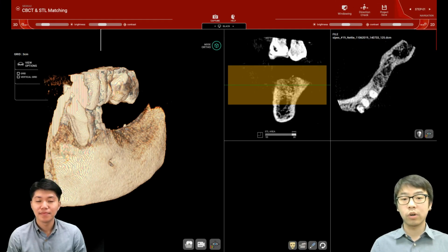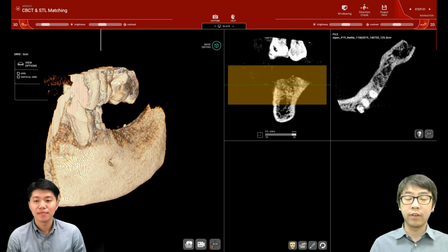And in this video, we're going to be talking about the very first step of the R2Gate program. Currently, we have an example pulled up for you guys. Nice and very simple case. No scatter or radiation, working on the lower, single implant. And Mike here is going to be guiding us through. But for me, I have no idea how to use the R2Gate program, but I want to learn.